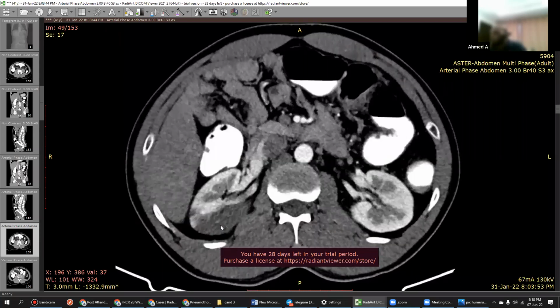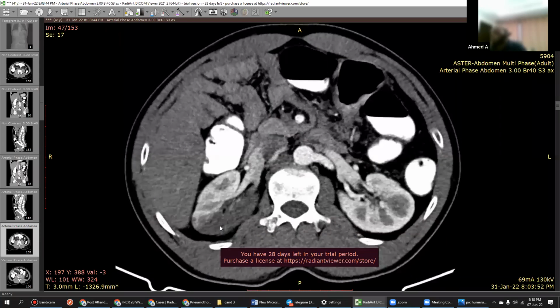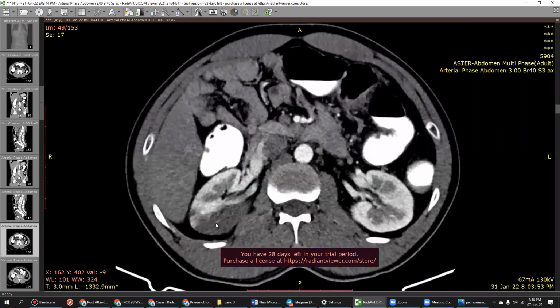In this case, why it is not pyelonephritis is clinical features. You should ask the patient: fever, pain. Understood? Renal infarct will be very acute. In pyelonephritis, the patient will have burning micturition and all this. You will tell, I'll correlate with the clinical features. But pyelonephritis will not occur like this. Half of the kidney is gone, you can see, right? So it will not occur like this.